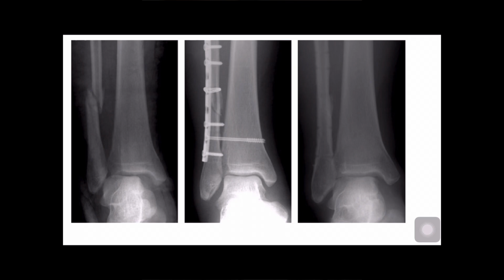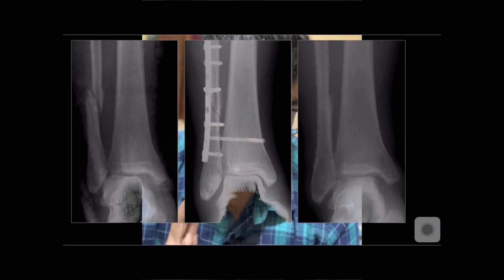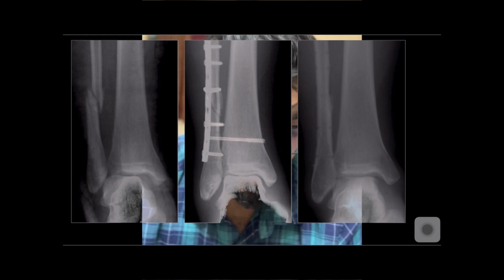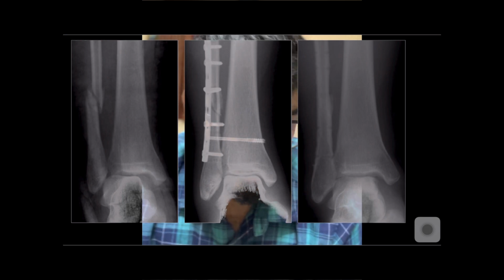Second thing, if there is a syndesmotic injury and we fix it, after doing the syndesmotic reduction and fixing it with the screw, your X-ray will look normal. If you look at this ankle mortise, it looks normal to me in the second image. After fixing the fibula and the syndesmosis, the medial clear space and the tibiotalar space, and the space between the distal fibula and the talus, also look normal.